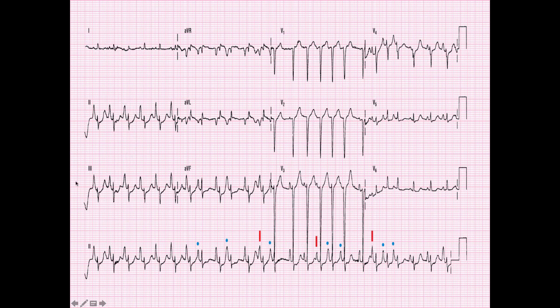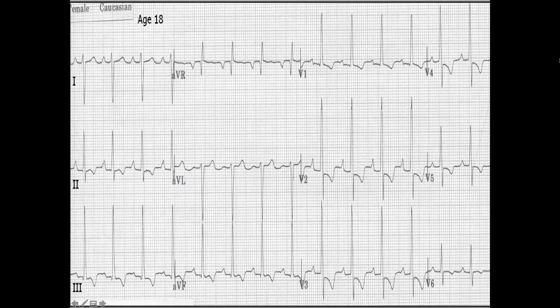We're looking for right atrial enlargement. These are definitely tall, peaked P waves. These are huge P waves. Holy mother, right? So we definitely have P pulmonale, classic finding of right atrial enlargement. Look to V1, and it's kind of hard to see the biphasic P waves in V1, but we have just classic P pulmonale here, so we have right atrial enlargement.